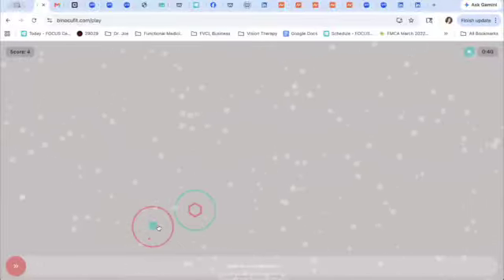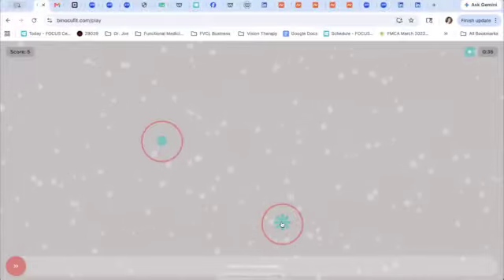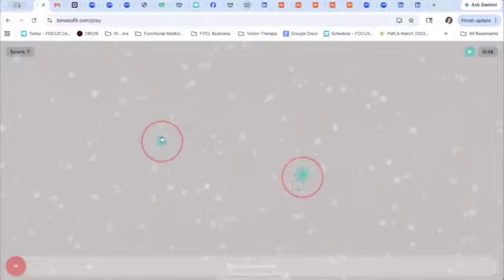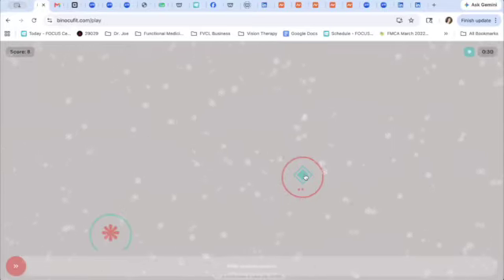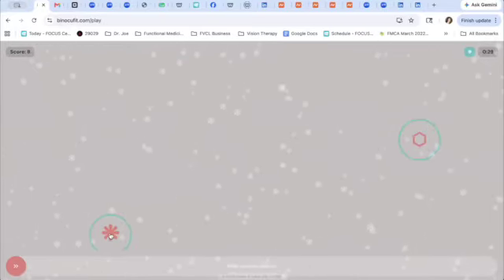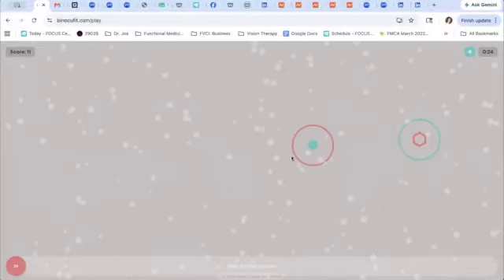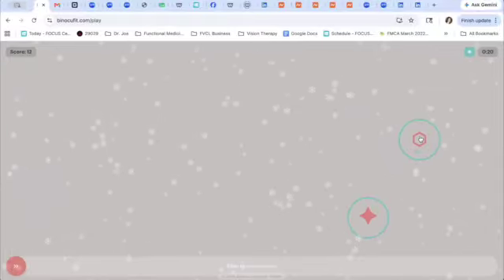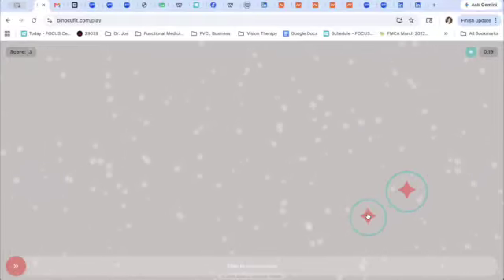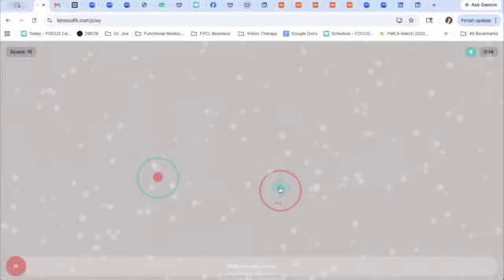Okay, and so this snow, if anybody has red-green glasses and they want to put them on as I'm demoing these things, it should work pretty nicely through the shared screen. I've worked with several patients through Zoom where I shared my screen and was able to give them access to my screen, and they were able to perform the games, and it was amazing. So that's another added benefit to how these things are designed.